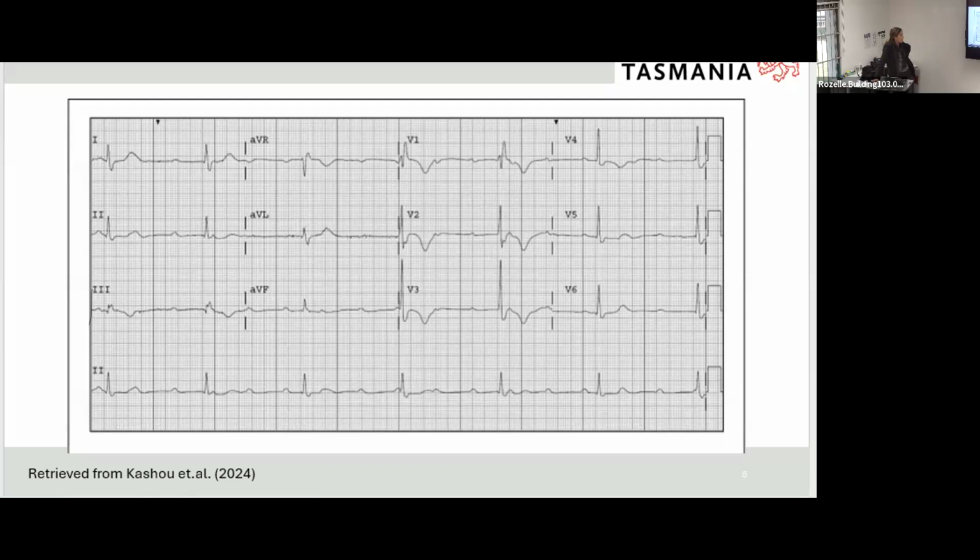And normally when we'd see a large difference in our P waves, they'd be a lot more obvious, especially in the distance and the length of the P wave as well. Whereas these ones are similar height, similar length. Amplitude similar, yeah. They're more similar than they are dissimilar, put it that way. I'd sort of say that.